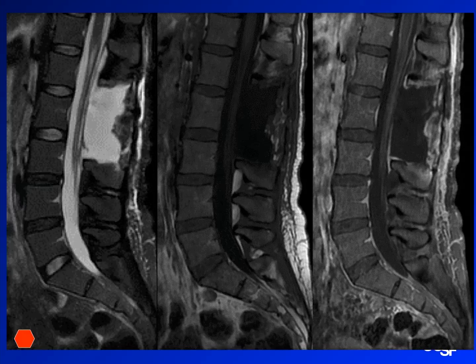All right, so the patient had a resection and came back with some pain. Yeah. So pain post resection, so T2 on the left, T1 in the middle, and then post-con, right? It is, yeah. Okay, so pain after surgery. I'm worried about acute post-surgical complications. Looks like there might be. Yeah, so there's something going on here, right? Yeah, for sure. But I guess I'm struggling to figure out what might be a normal post-surgical change.